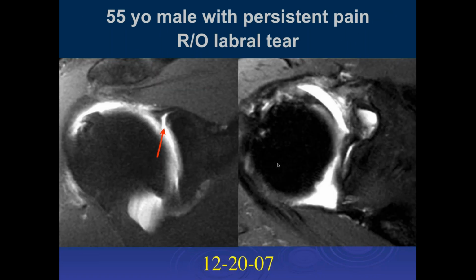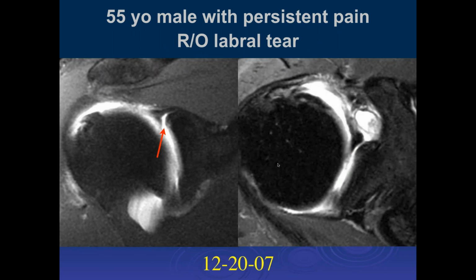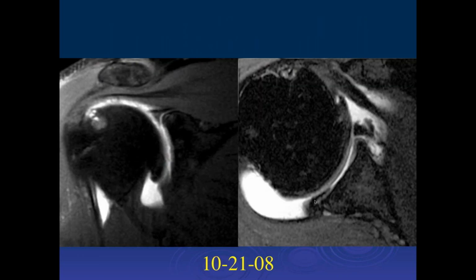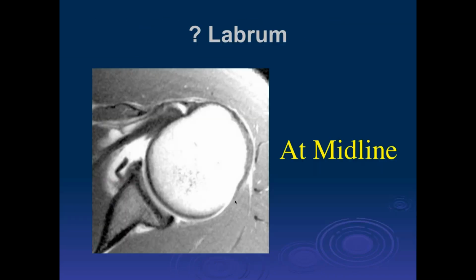Okay. Was there a posterior labral tear on the previous slide? I don't see it. I guess it was the very last image. Here? I think it was the last image that you showed. I don't remember. Okay, so this one? Yeah, I think it was there. I'd like to see other ones. Maybe. I don't think so. Okay.